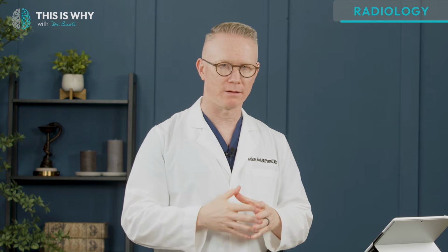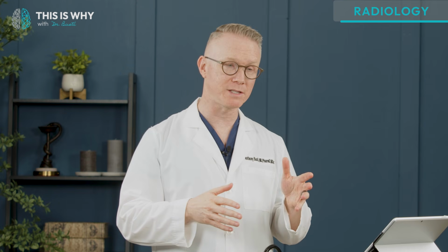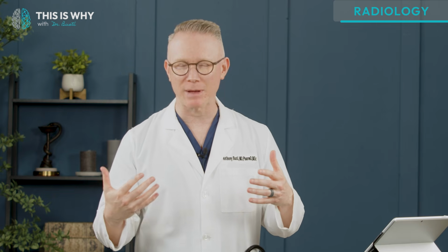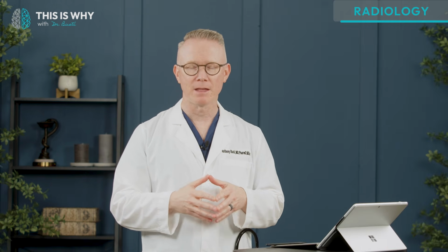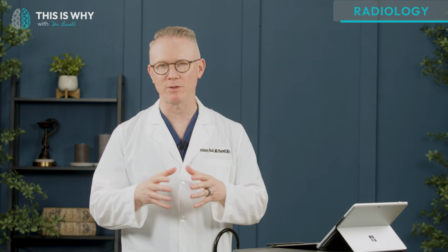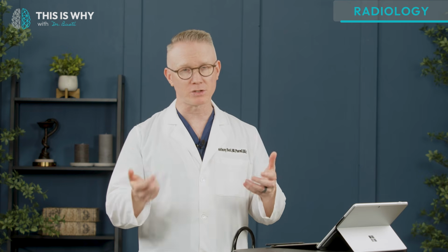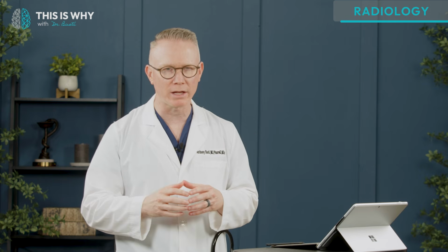Step one, we need to confirm the projection. AP versus PA. Is it well inspired, with good inspiratory effort? And is the patient non-rotated? That's what we want, okay? This is part of the RIPE mnemonic that I use in my own clinical practice, but I also teach about it in my other lectures to determine chest X-ray image quality.